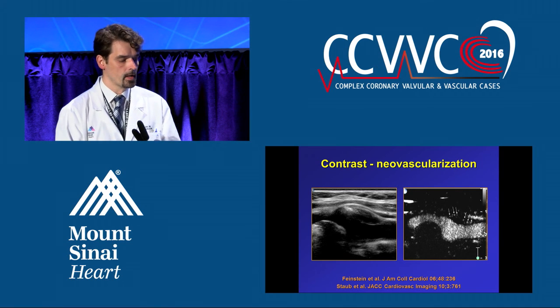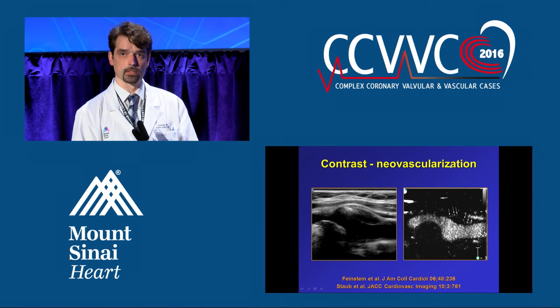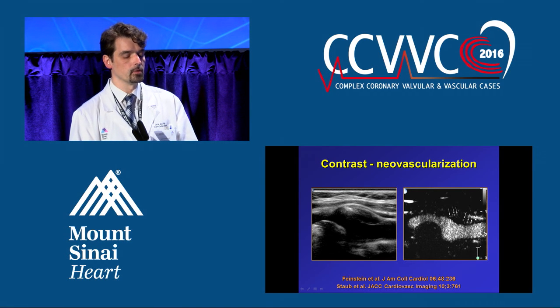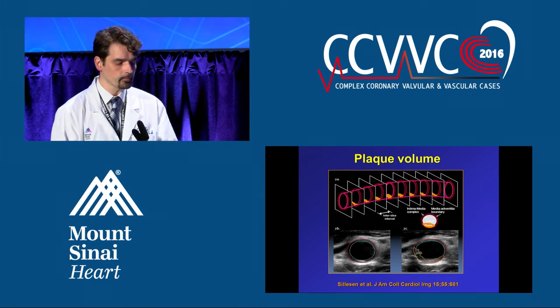And one more thing that we can do with ultrasound is try to see the neovessels, those small vessels that I told you about. So this is another example of a big plaque here, and then we give the contrast, the microbubbles, which are seen in the lumen here, and the small arrows point to some microbubbles that you can see inside of the plaque. So there is no data yet whether this actually is clinically meaningful, but again, some non-invasive ways of looking at this component of the plaque.